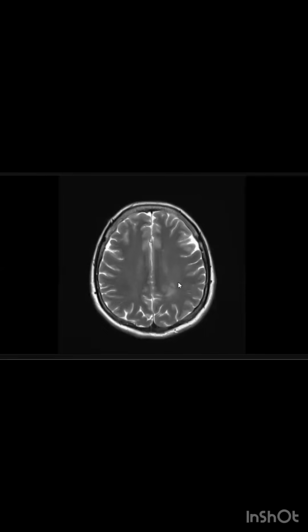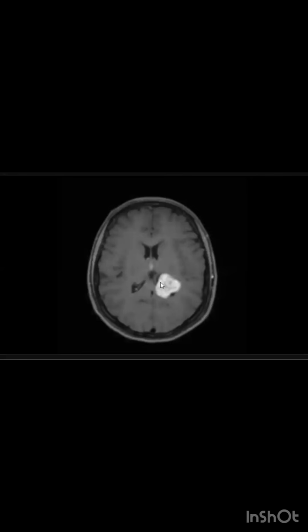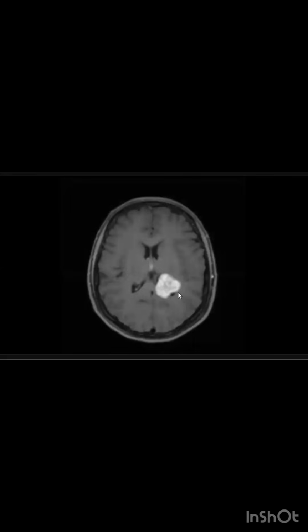You put choroid plexus papilloma, but against choroid plexus papilloma, there is no CSF overproduction, and it is not macrolobulated like choroid plexus papilloma. Also, carcinoma and papilloma are the same and will not differ more. But here, there is also homogeneous enhancement. You have to put intraventricular meningioma. You put it as first diagnosis at the end.